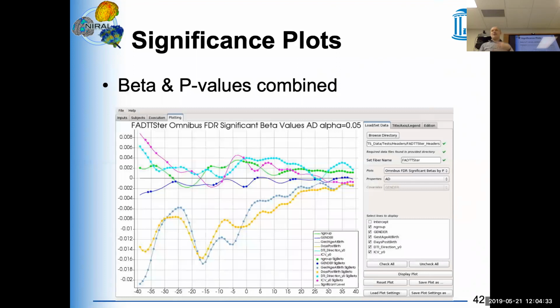And that's, in some sense, actually a bug in DTIAtlasFiberAnalyzer, because the tracts should not touch each other, even if they have the same output folder. There's no overlap in output files and so on. So we're not quite sure why it messes things up, but we know it does. So let's write it into separate folders.